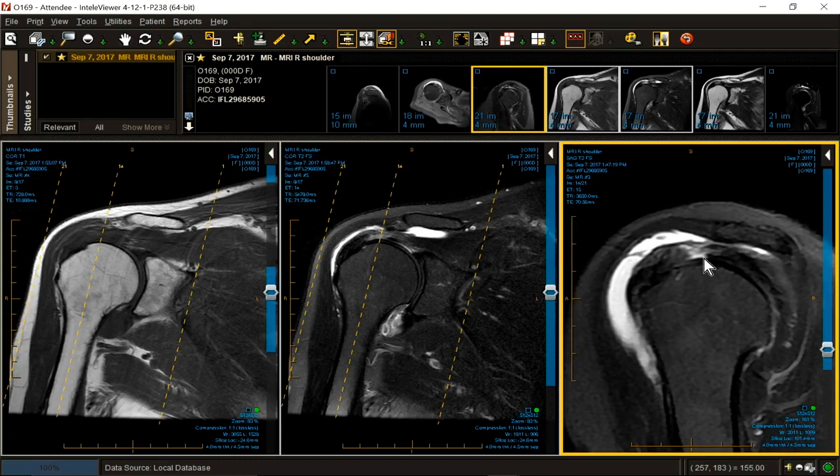So a get-out-of-jail-free card way of describing it is deep, penetrating, full or near full thickness tear. Give the dimensions, give the location, you're done. And make sure you tell them whether it's concealed or non-concealed. So in this case, they might have to perforate a few fibers on the bursal side if they come from the outside. And you can tell them that, and that's fine.